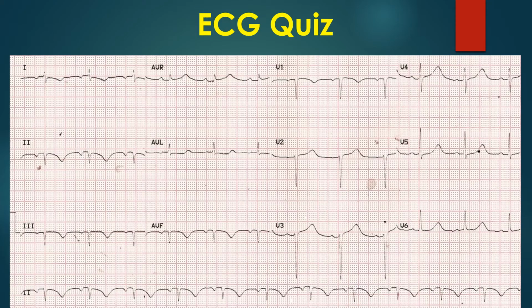In left atrial rhythm, one would expect P inversion in lead 1, V6 and inferior leads, but that will not change the QRS pattern or T waves. Here we have QS complexes in inferior leads with T wave inversion. Downsloping ST with T wave inversion is seen in lead 1.